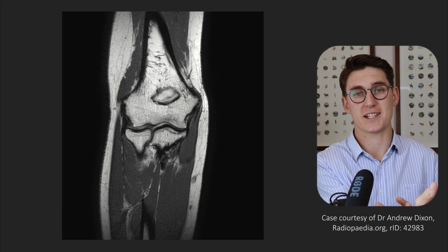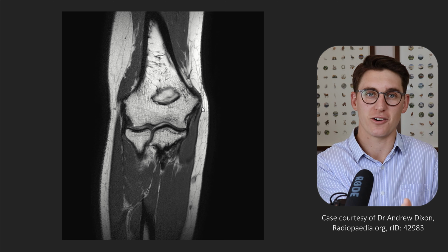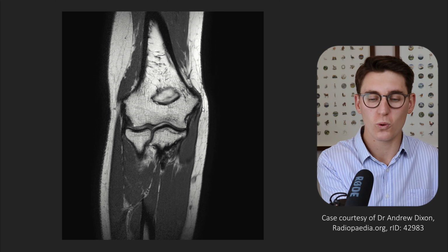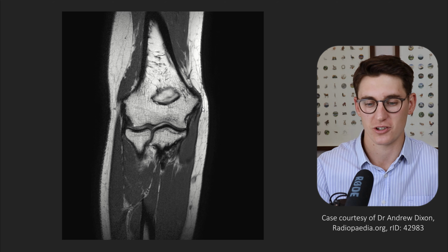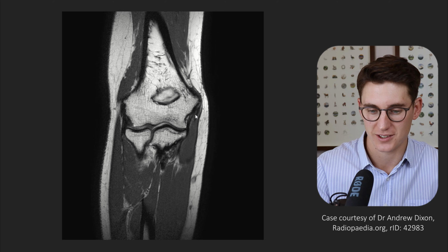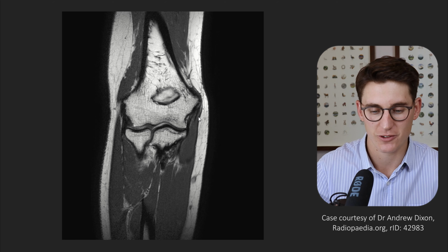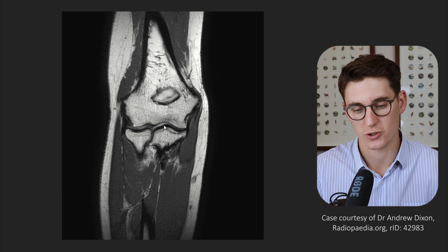We also have our flexor carpi ulnaris, our flexor carpi radialis. We've got our flexor digitorum superficialis and our palmaris longus, all coming from that common flexor origin of the medial epicondyle, our common flexor tendon here. So our tendons lie more superficial than our ligaments. Let's have a look at some of the ligaments that provide stability to this elbow joint.